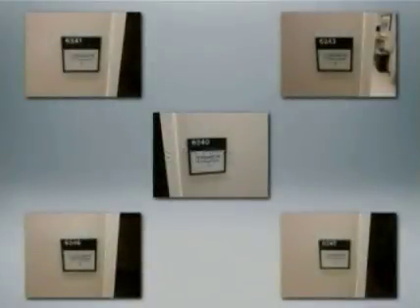We have 5 inpatient scanning rooms at UAB, shown here. Unfortunately, despite having lots of transducers of different types, we only have one of these 3D transducers and only one machine it works on. And Murphy's Law being what it is, most of the time when I want to do a 3D acquisition on a patient, the machine or the transducer is in use somewhere else.